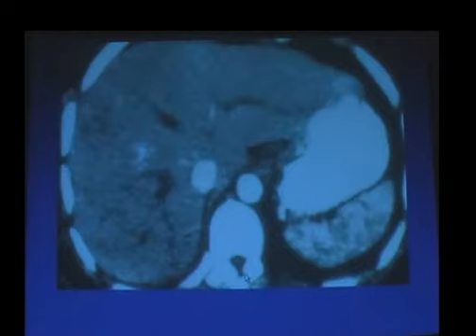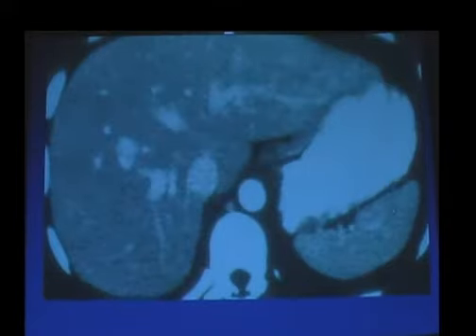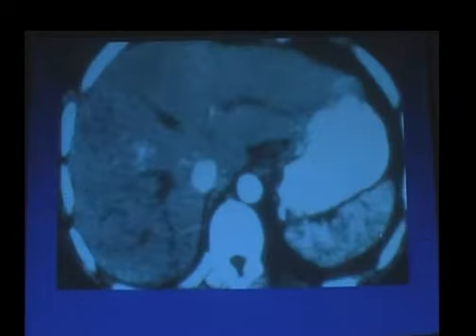This is another pitfall. You can see that the spleen looks very heterogeneous in this case, and that's because this is an arterial phase image that I took from a patient who had a three-phase study of the liver. This is the portal phase, and you can see that the spleen is normal in appearance during this phase. So, of course, you never want to try and diagnose injury during the arterial phase. And, of course, the next question is, why would you ever scan during the arterial phase? And I know you wouldn't be crazy enough to try and do that when you have a trauma patient.